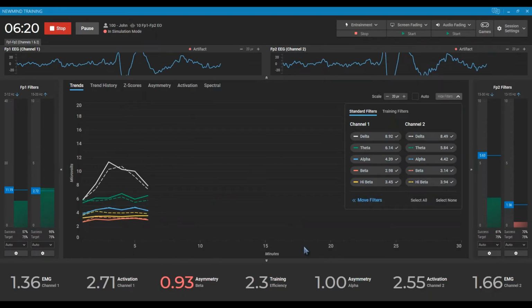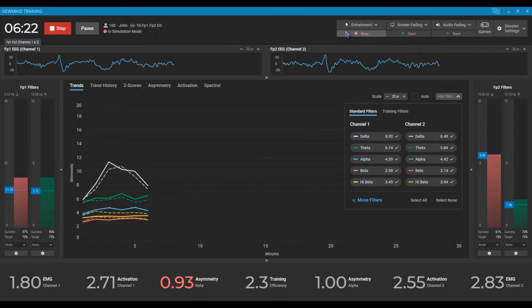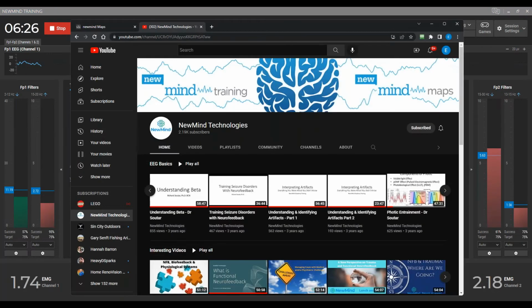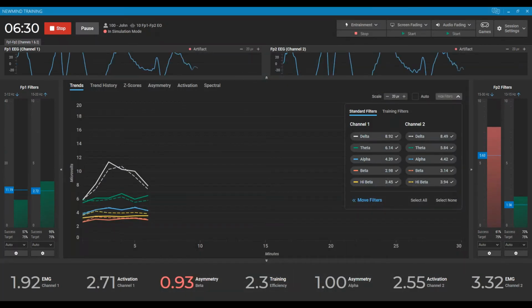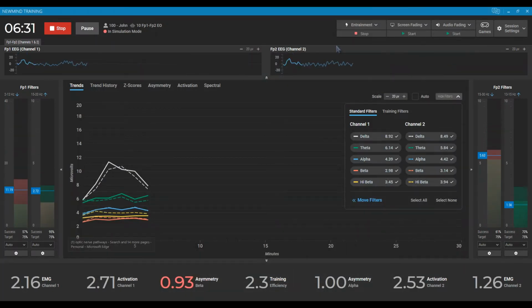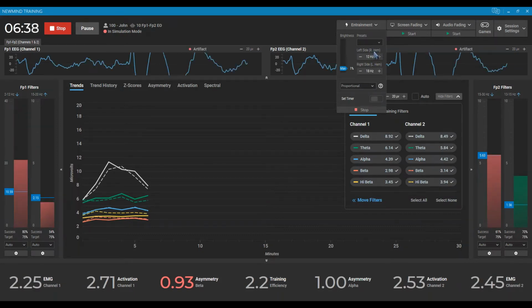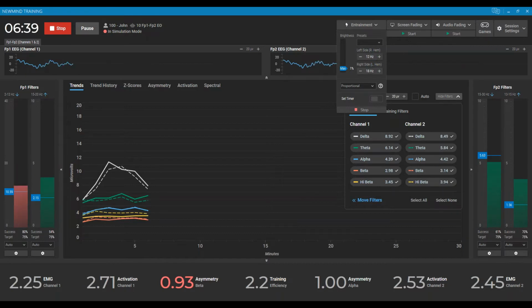So with our software, I'll just leave that there. Can't get them both at the same time. Let's see. There we go. That picture explains it really well. Thank you. Okay, so that made sense.